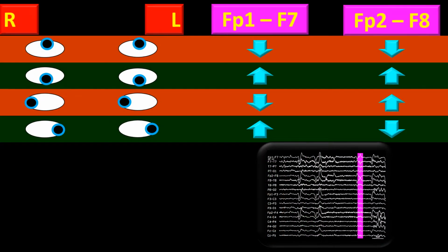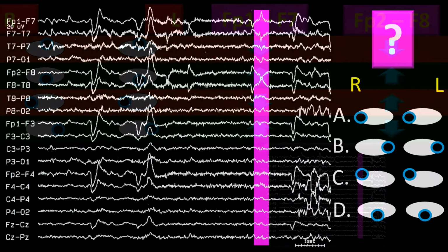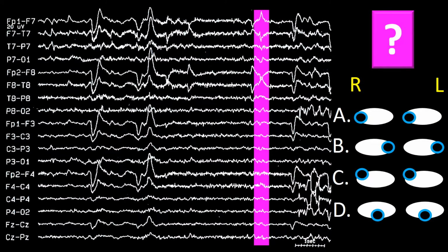So this can be represented in this general figure as the eyes looking towards the left. So the answer to this question is B.